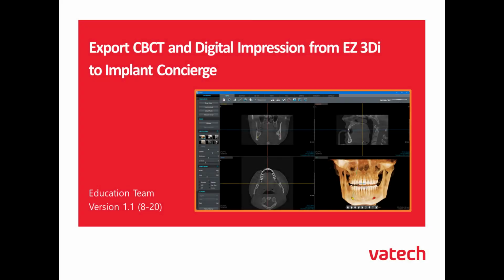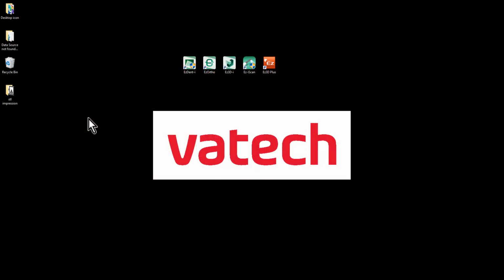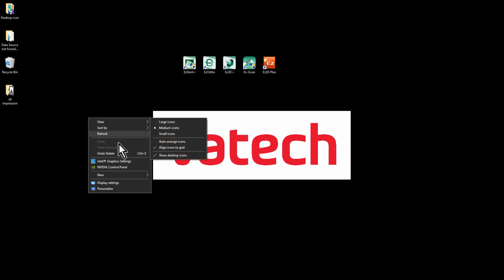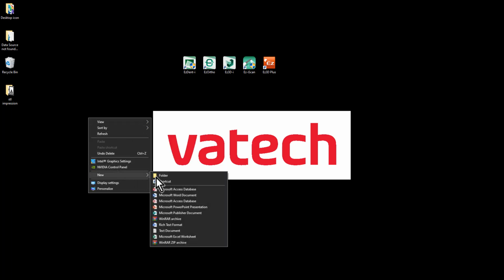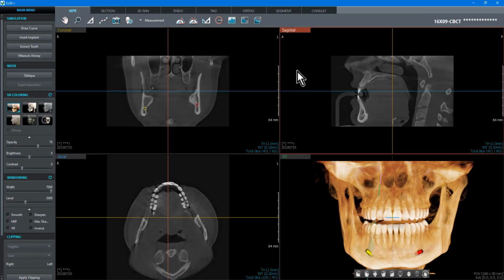In this video tutorial, we'll go through the steps to export a CBCT and digital impression from Ez3D-i and upload it to Implant Concierge. The first thing we'll do is right-click on the desktop and create a desktop folder and name it after our patient that will be exported. Once you've saved it, we can then navigate to the Ez3D-i software.